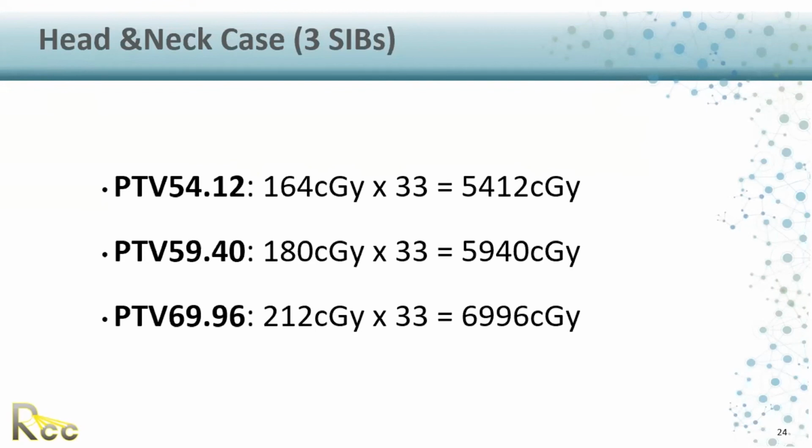I mean, there will be a splitting between them, as I showed you in the plan, the excellent plan that was submitted. He could do this easily using the third arc and putting some effort on the optimizer. Then he will make sure the 50% doesn't intersect from the left side to the right side and up and down. Fantastic. I answered another question in the chat.